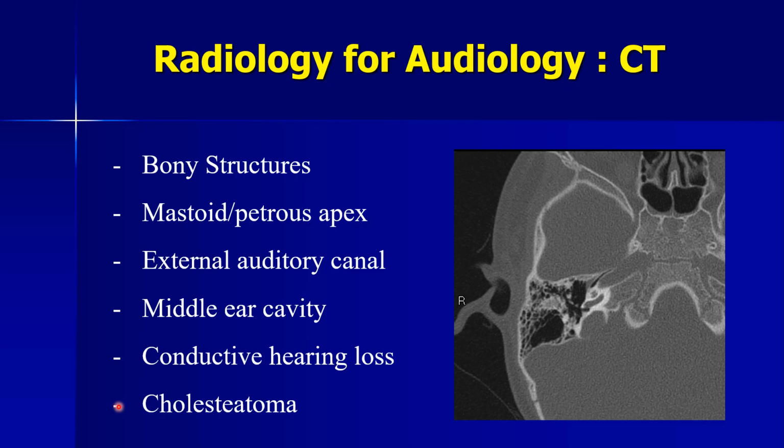However, sometimes when the cholesteatomas are very small and early stage, they do not cause bone erosion because of the small size.